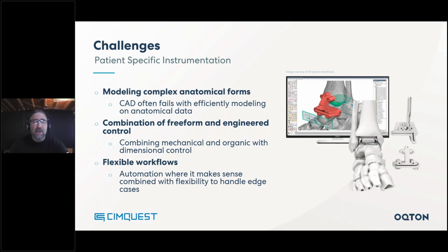Speaking of which, the type of workflows that Freeform is capable of processing is limitless. If you've used systems such as automated systems, you will have encountered times where edge cases or challenging geometry just do not work. Freeform allows you to handle 100% of these cases.